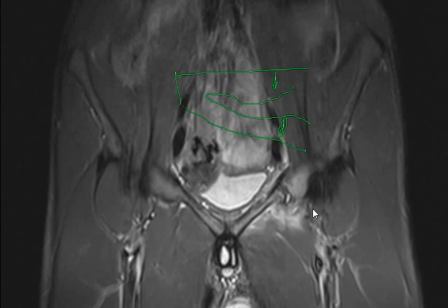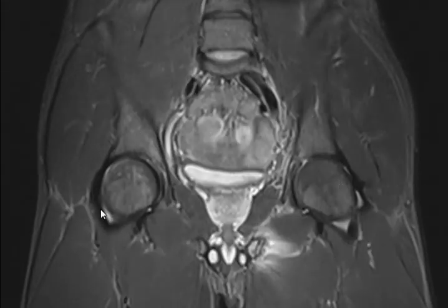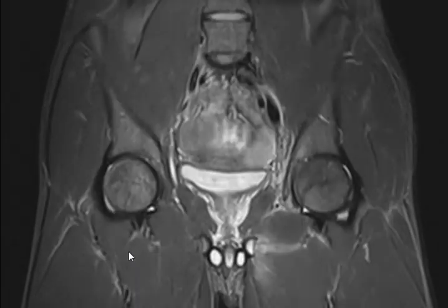First. Second, in the beginning, I told you there is no history of trauma. He has negative past medical history, negative past surgical history. So why would we jump to a metastatic lesion? There must be something, and he's 22 years old, he's very young. So there must be something easier to explain that. So what do you think? Stress fracture is a possibility. If you look carefully, he is a very muscular guy. See the muscles, all muscles. He is a very muscular guy.